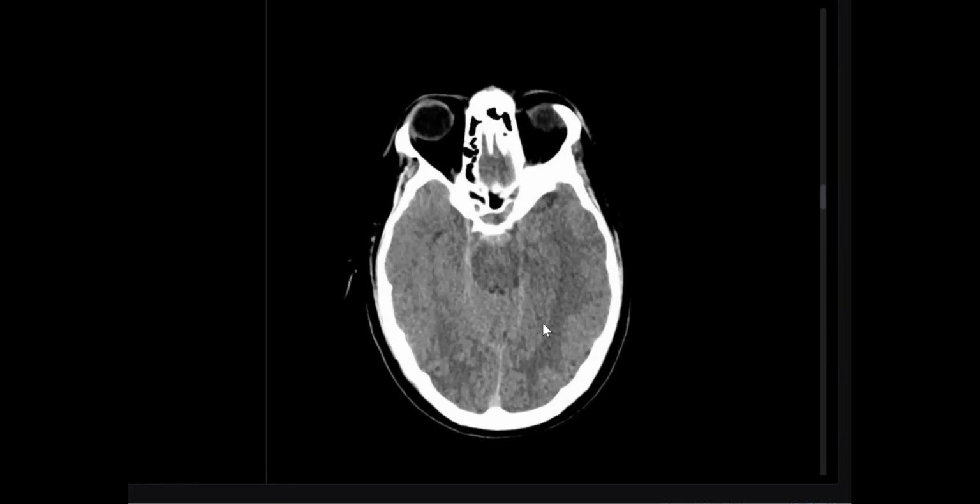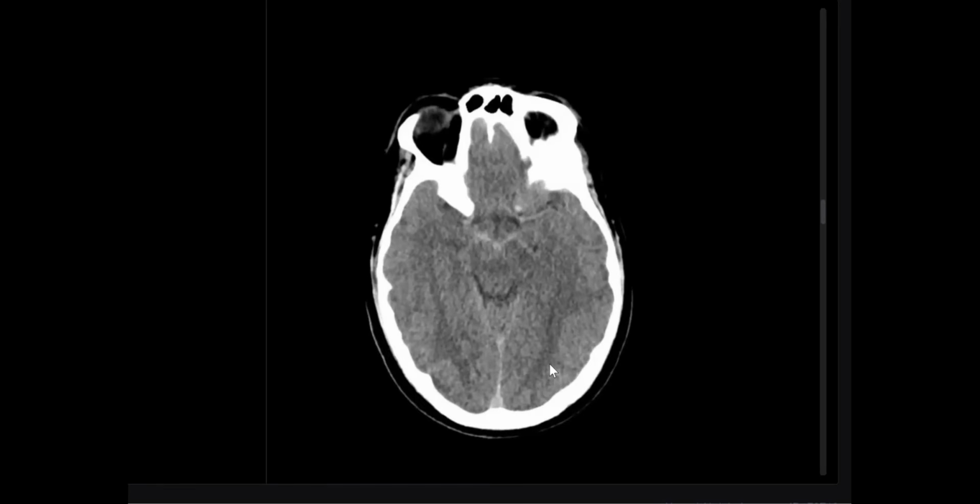Here, I should see only one dot related to the basilar artery. But I see a broad area of hyperdensity facing the prepontine cistern and also part of the prepontine cistern, interpeduncular and ambient. So, what is your diagnosis first and what is the pertinent negative?